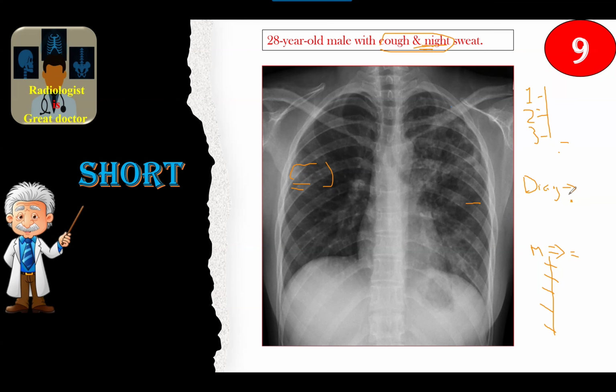Radiological findings and the given history are suggestive of pulmonary tuberculosis, post-primary most likely. Management, as you said: urgent referral, or urgently convey the findings, and advise immediate isolation of the patient, screening of the relatives, and sputum analysis, sputum culture and sensitivity, with CT scan. Full management of tuberculosis should be mentioned.